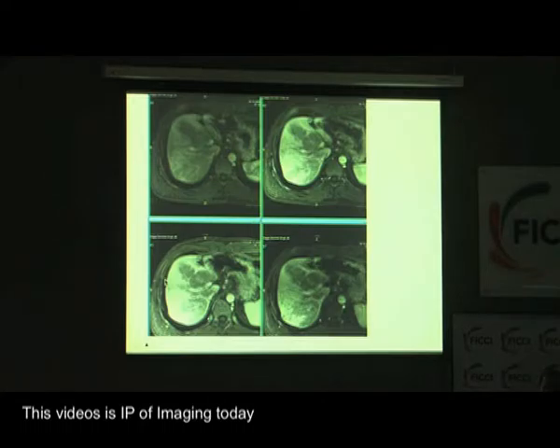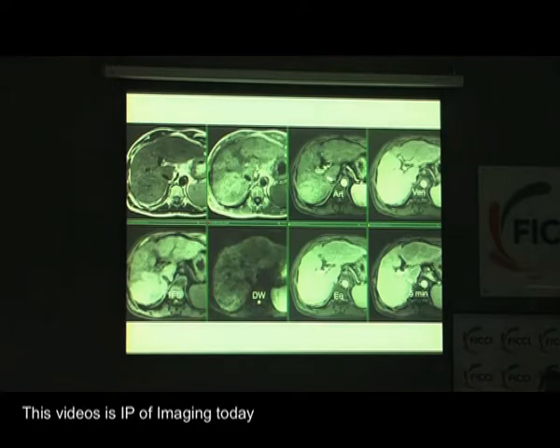If we were looking for a focal lesion which had a fibrotic component, you can use purely intravascular contrast media and do not have to go for hepatobiliary agents. When you do have confluent fibrosis, it can also show restricted diffusion. This is a diffusion weighted scan where you're seeing hyperintensities in the area of fibrosis. But what is characteristic is that wherever you have the abnormality, and that is the fibrosis, there is a flattening of the liver contour.